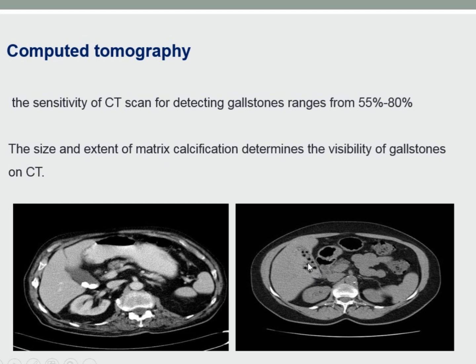These are stones, but they are not well calcified. What's the content here? It may be mucousy, and these are fat or cholesterol containing. Inside the bowel they are also visualized because of fat content, because they are the same density as this fat. You see, this is the same as this, because these stones are cholesterol stones, while here they contain calcium.